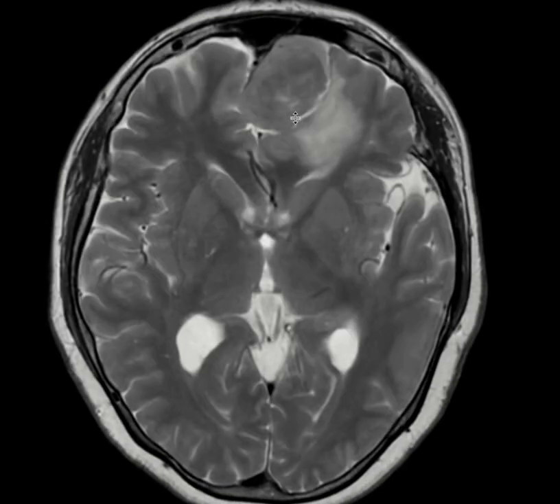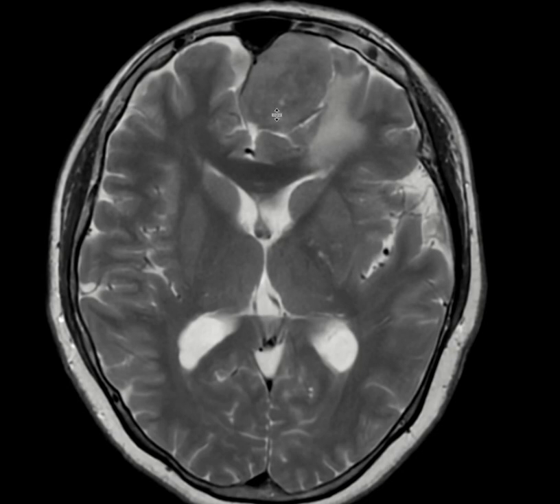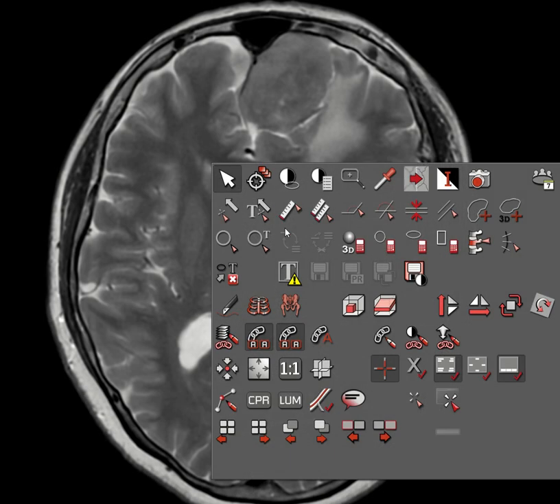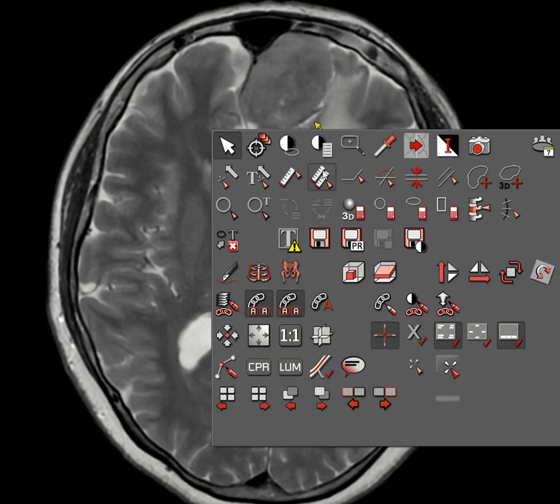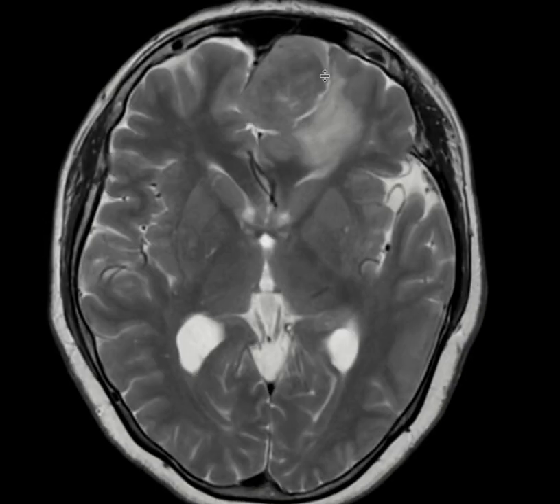First of all, when you look at this mass very closely, this is a T2 isointense mass, and surrounding it there are some areas of CSF-isointense material between this mass and the brain parenchyma. If I show you this more closely, you look at these areas, and you see some CSF signal that is separating the actual lesion from the surrounding brain parenchyma. You see it here very well. So this is called the CSF cleft sign.